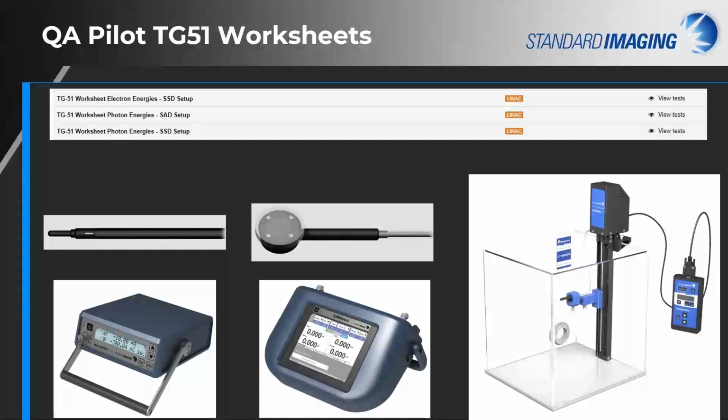Notifications on recalibration due dates are set, as are any other periodic tasks that require the use of a specific device, such as chamber intercomparisons. Devices can also be assigned to a primary location and tracked, as you may lend them to a different vault or to another site within your group. You can keep track of those things and monitor them as well.